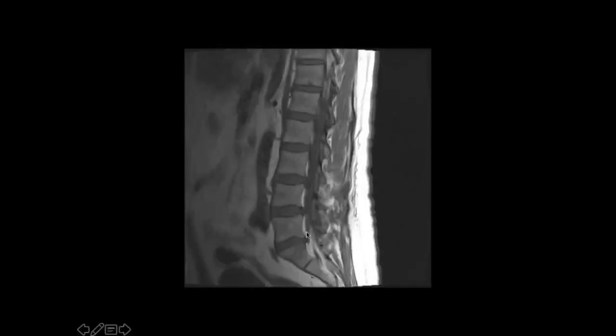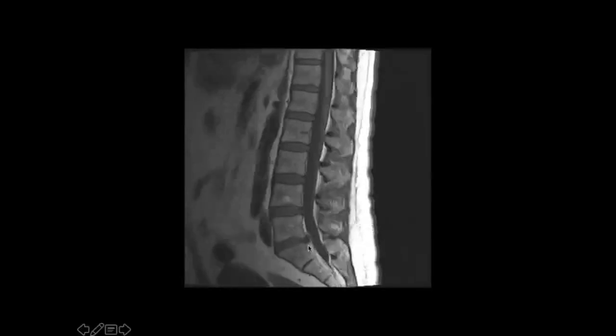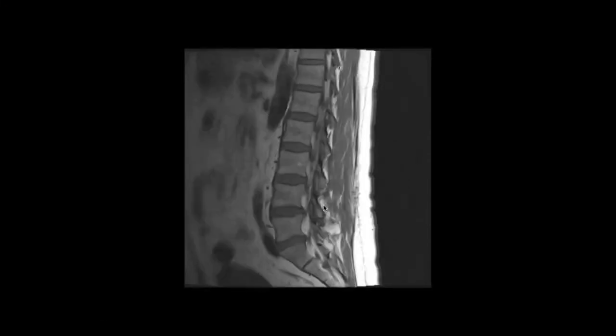And in this particular case, you can see that there's a disc protrusion which is causing indentation of the thecal sac, but the neural foramina seems to be clear. That's the region of the facet joint, and again, you can see that that's a bit degenerative as compared to the other facet joints over here. So just all the things that need to be incorporated into the report.